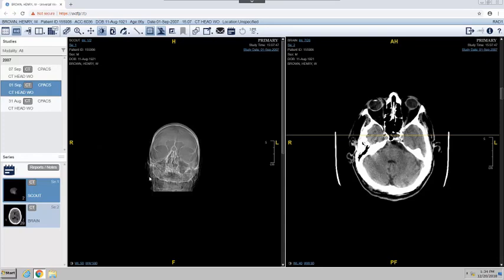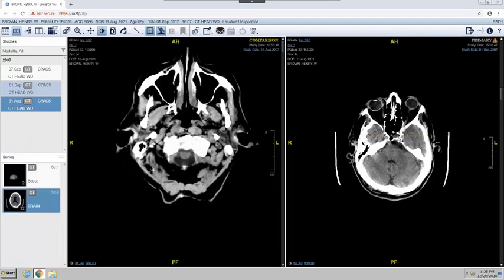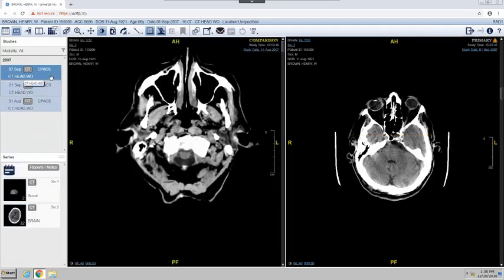The navigator contains all studies available for a patient in chronological order. To open a series from an online study, you can drag and drop, or you can also select the series in the navigator with a double click and the series loads into the active viewport.